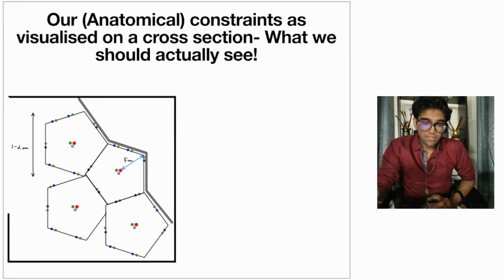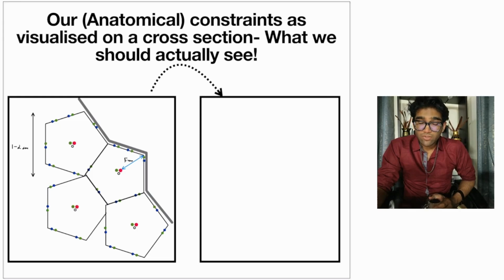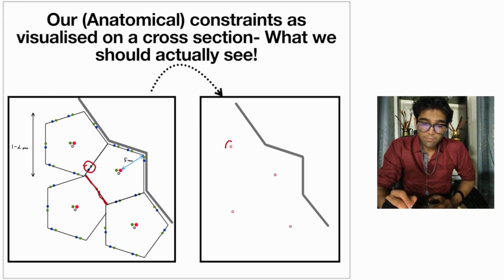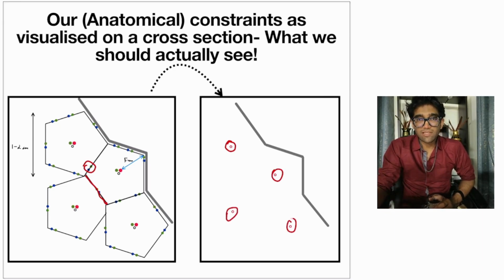As we've already previously discussed, this is not what we actually see because of the limits of resolution of CT. A CT scan machine at its highest resolution is able to delineate points that are around 1 millimeter separated from each other. However, what we find here is that these structures, the septa, the small lymphatics and veins, are smaller than that. Because they're smaller than that, they are not perceptible. The only structure that is sometimes perceptible is the branch of the pulmonary artery located at the center of the lobule, and I've given it a red color, but obviously on a CT scan it looks white.